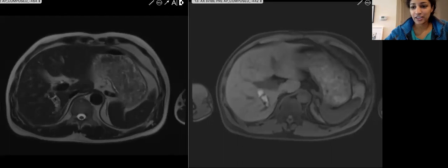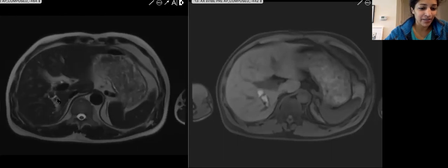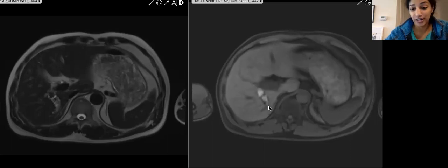Okay, we've got Rajesh saying RPC, recurrent pyogenic cholangitis. Anu says intraductal stone. Perfect. So we can see that there's segmental dilation of the posterior ducts here with all of these filling defects in it on the T2. And on the T1 pre-contrast, these stones were all bright.